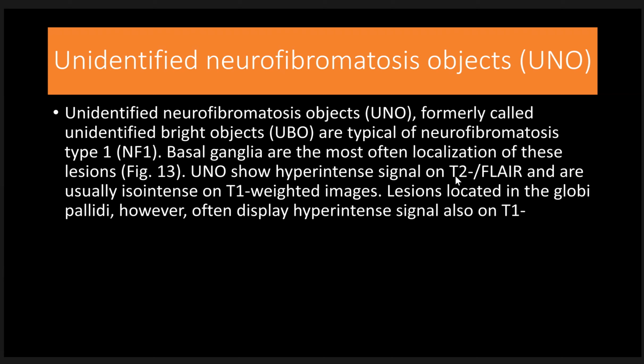The basal ganglia are most often involved, with localization in the lesion, and it shows hyperintense signal on T2 and FLAIR images, and isointense on T1.